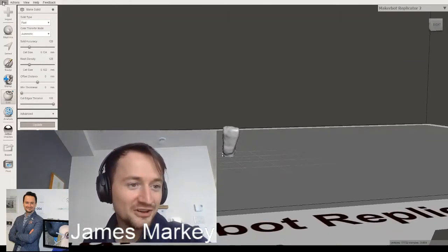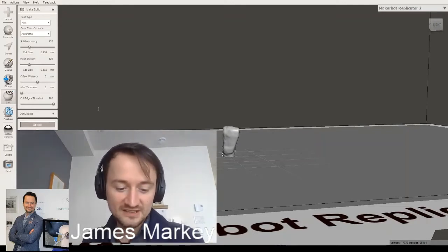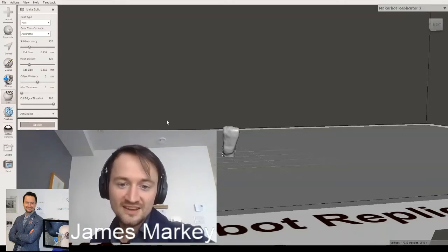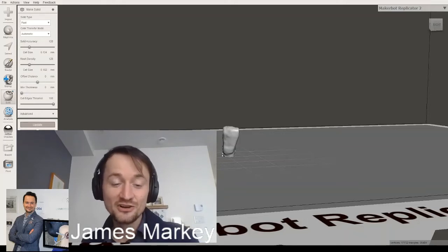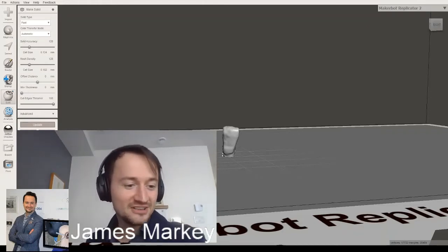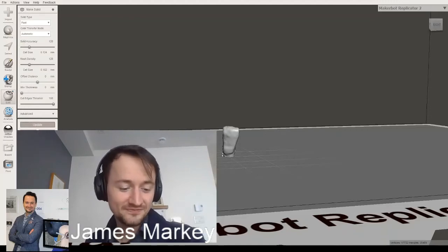So I'm just going to go File and Export, and then I'm going to name this Intra-Oral 1 Tooth. And that's it. If we just want to add in the density of the dentine, that's all we actually have to do in Meshmixer. So now I'm going to launch Virteasy Editor and take you through the workflow.